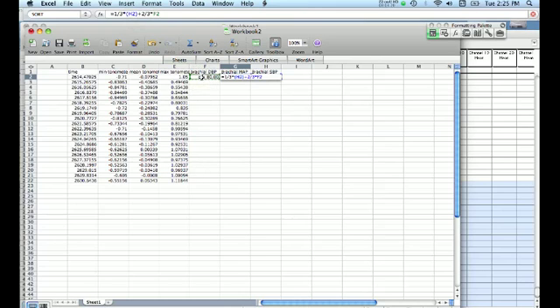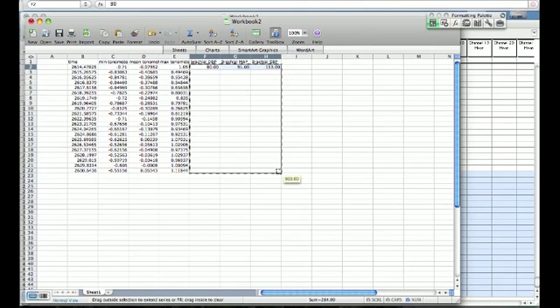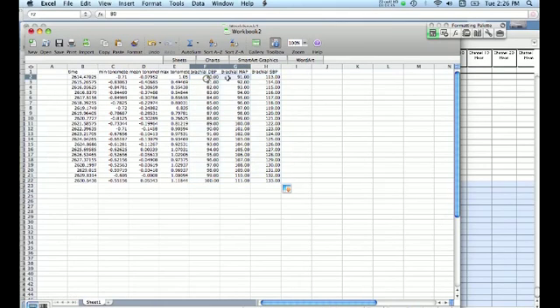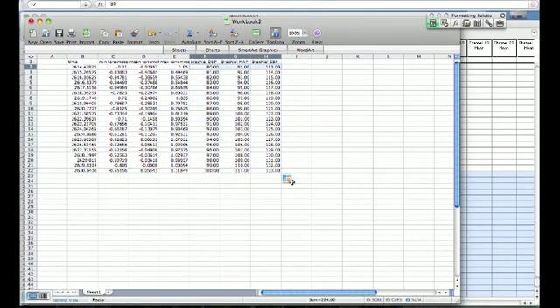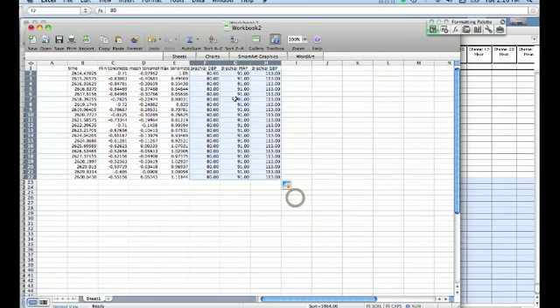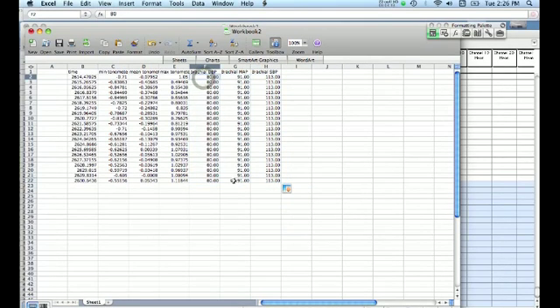If you don't know why this equation exists, go read up about it. We can take these and assume that for every one of those 20 beats, brachial blood pressure was very similar. So we'll just drag that down, or copy them and paste them into all these cells.